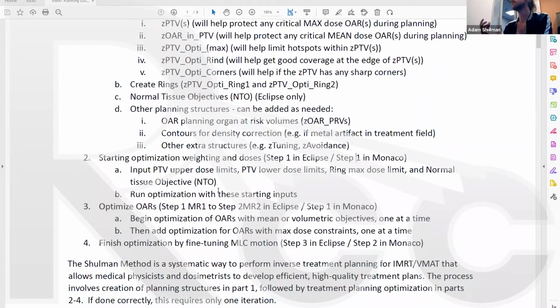If you find that you have to do some sort of coarse adjustment, you've forgotten something near the end of your optimization, just start over, go back to the beginning. Otherwise, the optimizer won't work in your favor. That's how an optimizer works.